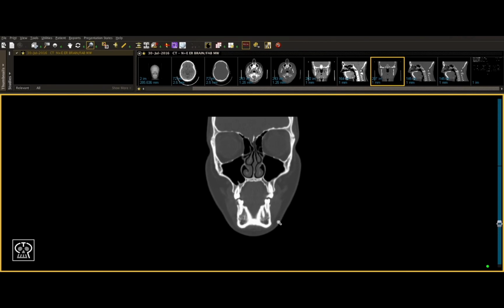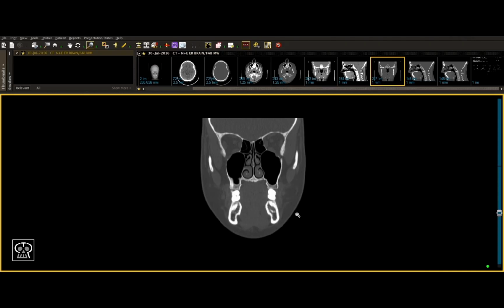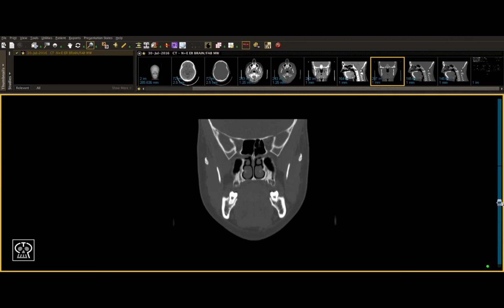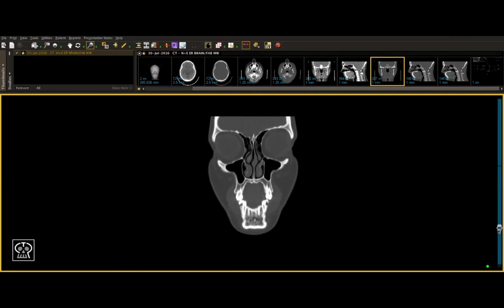As you're able to tell while we're doing this, everything needs to be systematic and thorough. It's important that when you're going through one side or one view, you should only have to do it once. You don't want to scroll at the beginning, check a little bit of the right side, come back, check the left side, and keep going back and forth. You want to start at the front, go all the way back, be very thorough, then come back to the front and switch.